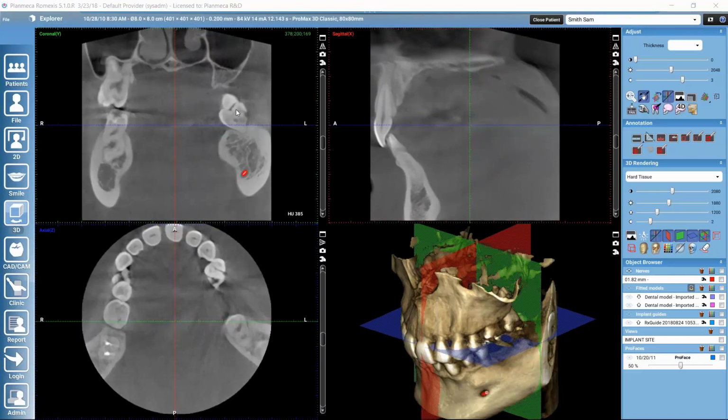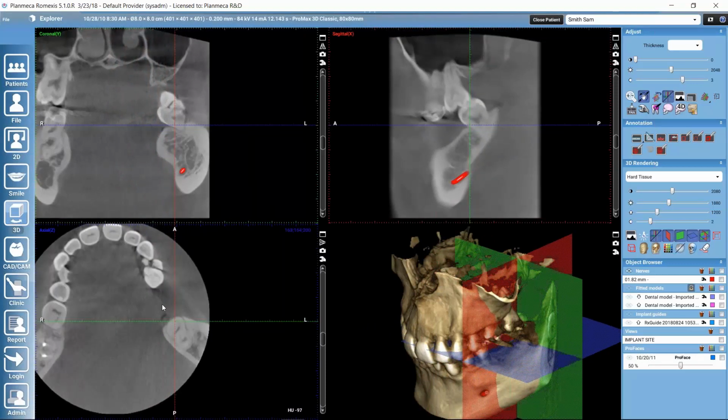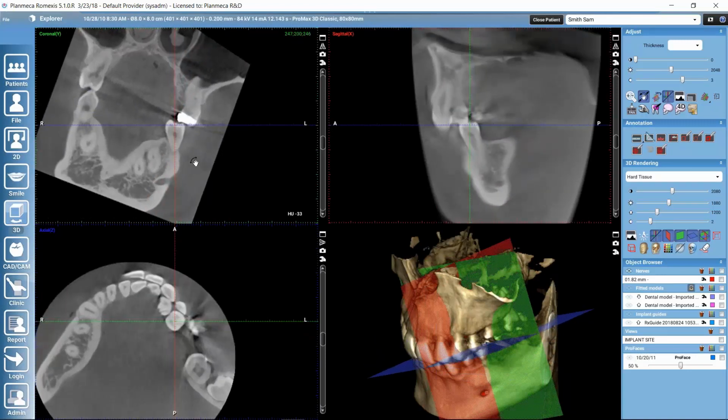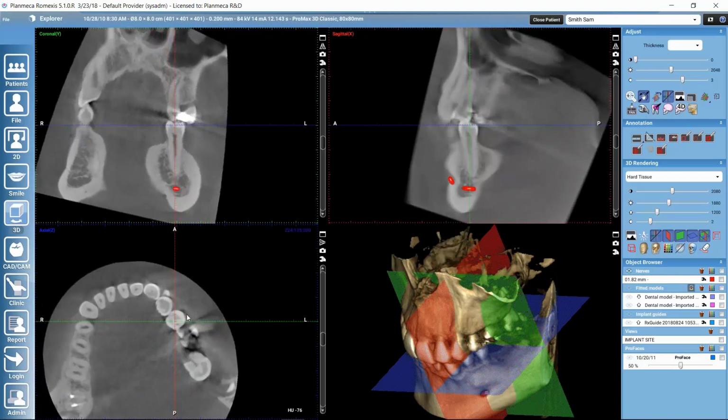We can grab with the mouse the volume, and we can move the volume so that we have our area of interest in the volume here on the focus of the planes. And so we can move with left mouse button, and with right mouse button we can rotate the volume. So this way we can generate the kind of view that we would be interested in.